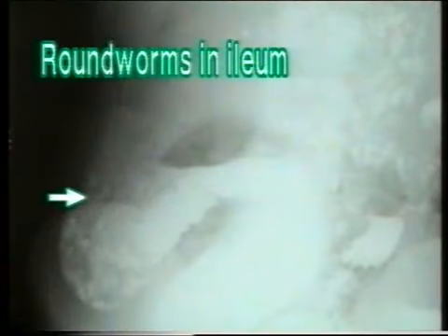But sometimes large bunches of roundworms may be seen during a barium meal examination. In this X-ray, note the faint shadows of roundworms lined by barium filling the bowel loops. In close-up view, some of the radiolucent shadows are typically elongated in the shape of the roundworms.